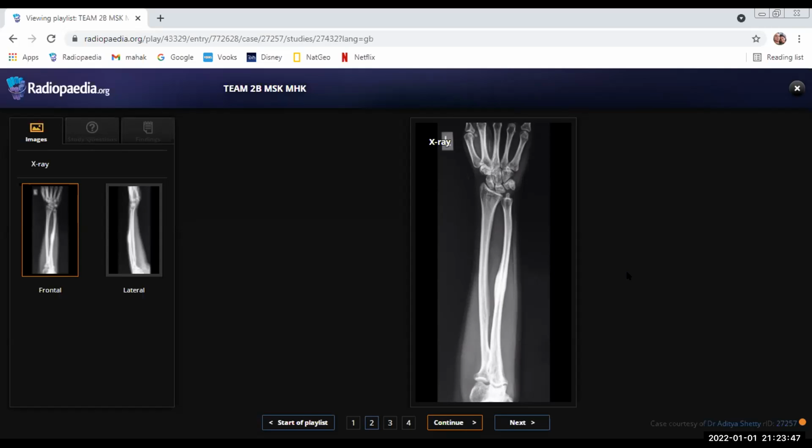And I would ask the patient if he has nocturnal pain and whether it is relieved with NSAIDs, and would advise a CT or an MRI for further evaluation. Okay, and what would be your other differentials? The other differential could be chronic osteomyelitis. I would ask him if he has a previous history of infection. That would be my second differential. Okay, what would you prefer, CT or MR? CT. Okay.